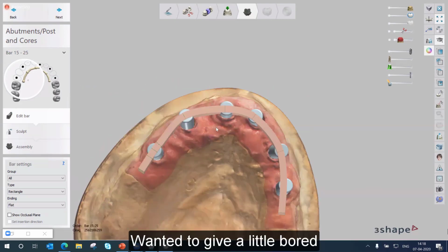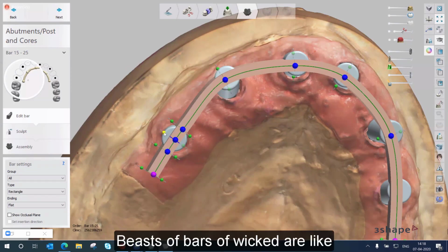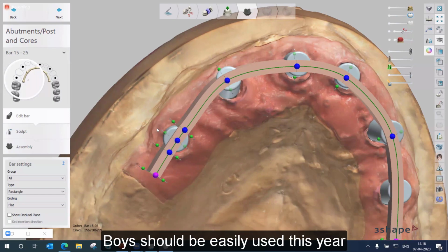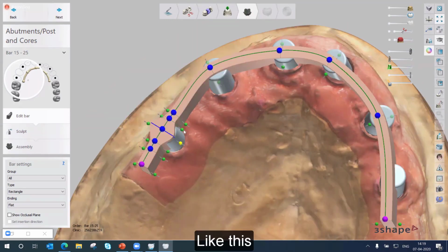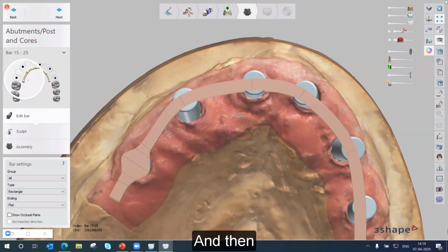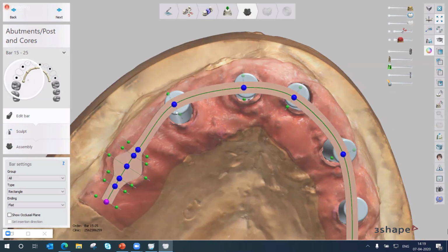And now if I want to give a little more aesthetic bar, so that the holes in these bars get covered, I can easily use these tabs over here to increase or give proper support near these pillars. So I can just increase like this, and I can do it for all. I'll just quickly do it for all.